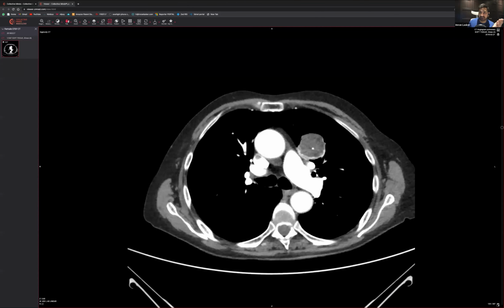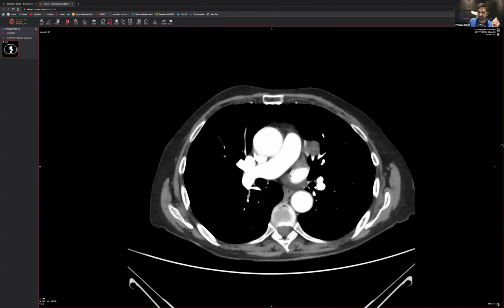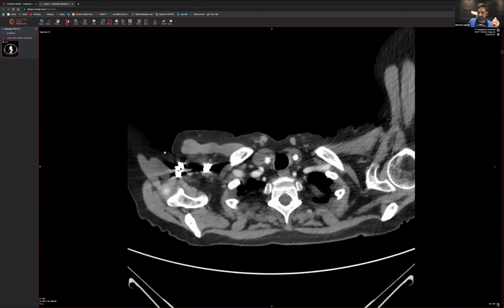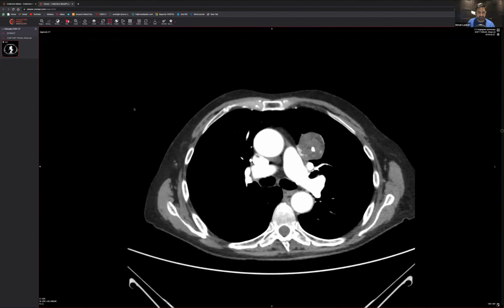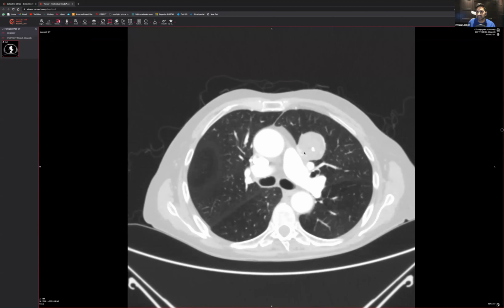But what you can actually see is a very well circumscribed lesion located within this area over here. Someone said, is this tracheal deviation? Not really. It can wave a bit, but it's not really pushed in any particular direction. What we do have is this lesion over here. Can everyone see that? Usually you should be able to choose a window, so let's go for lung windows. And again, you can see this lesion sitting over here. Very well circumscribed.